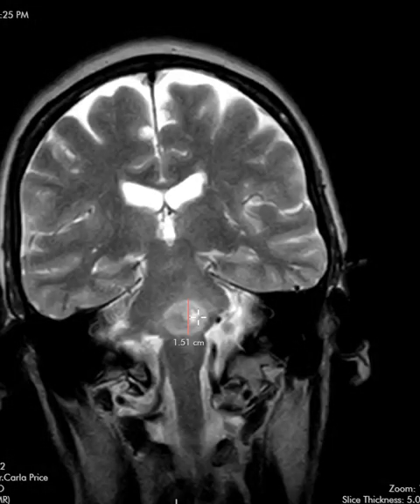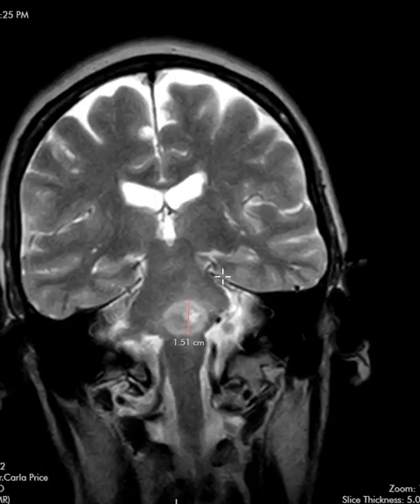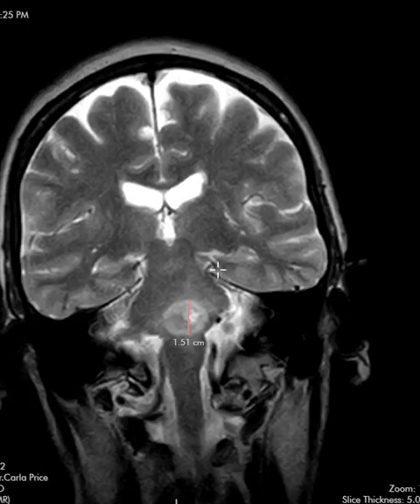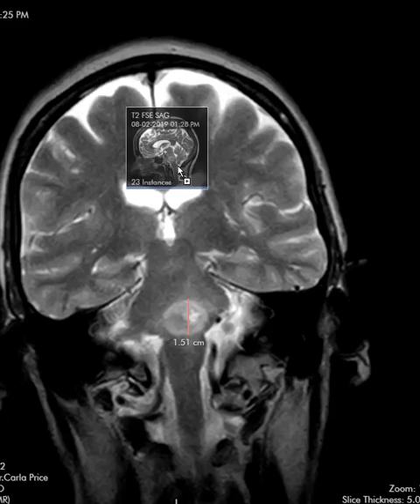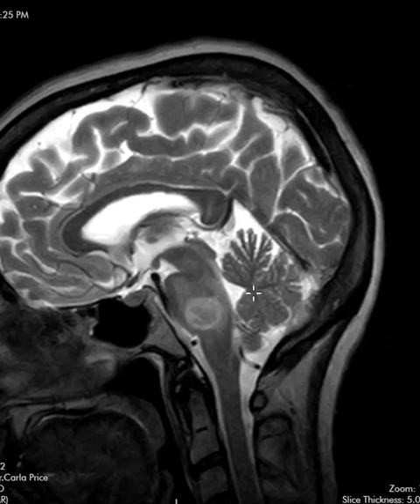We see a lesion here in the brainstem that looks like a tumor, but this could be active tumefactive MS plaque. They're going to look just like a tumor or infectious etiology. And so this is again nonspecific, but given the clinical history and neurologist, we thought this was probably a manifestation of MS that we call tumefactive MS because it looks just like a tumor. Here it is in a sagittal view here. And that's it. So several different presentations of multiple sclerosis, and thank you very much.